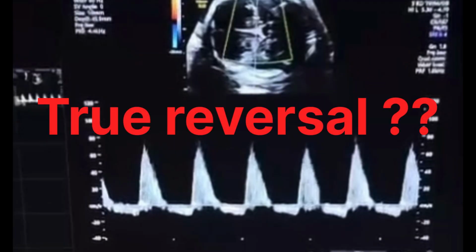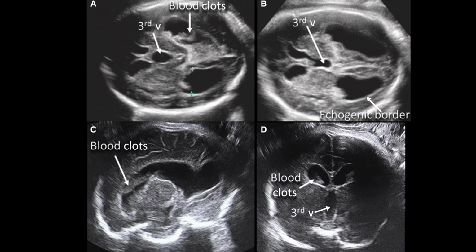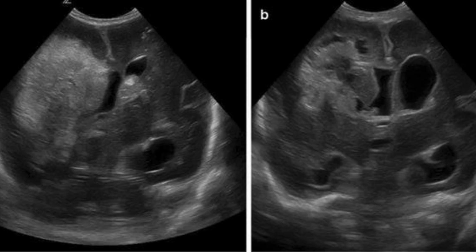Persistent true reversal is rare and, depending on the clinical situation, may be associated with severe intracranial pathology such as intracranial hemorrhage, severe cerebral edema, markedly raised intracranial pressure, or terminal fetal compromise.